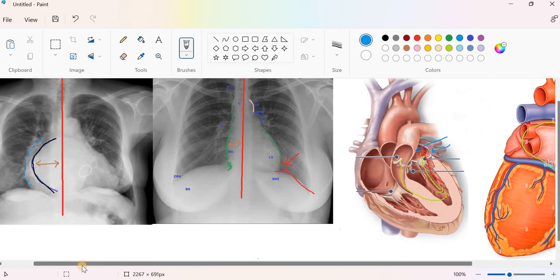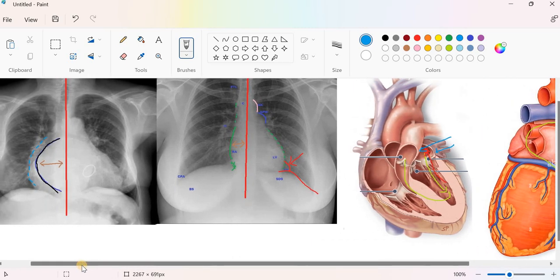One thing denoting also the left atrial enlargement, you will see that the carina, the angle between both bronchi, is obtuse. I'll try to make this clear for you to see instead of my scribbling here over the image. What do I mean by carina angle?